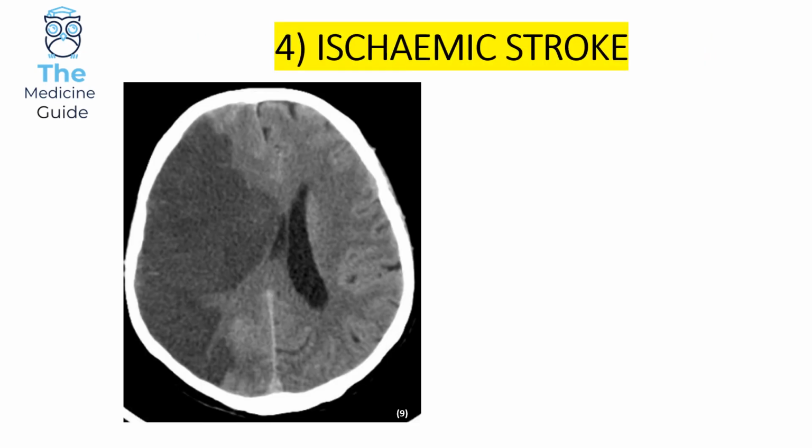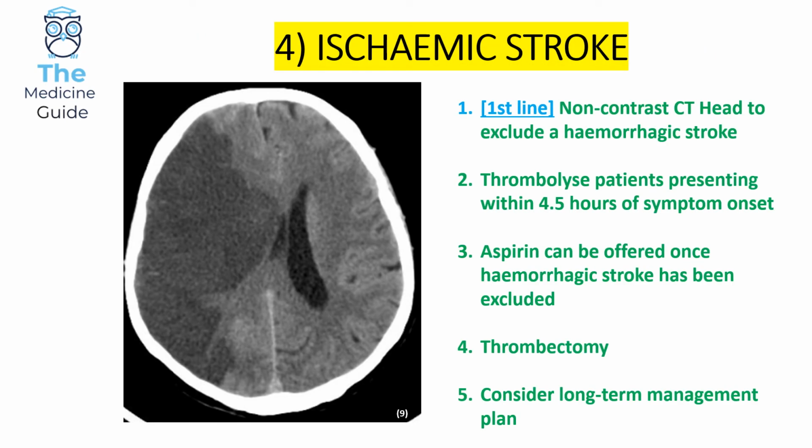So this is an example of an ischemic stroke. I think the management of an ischemic stroke is really important, and if they were going to examine you on any aspect of an ischemic stroke, I think that management would be the key, most examinable topic that they would crop out for the ischemic stroke. So let's go through this in a bit of detail.